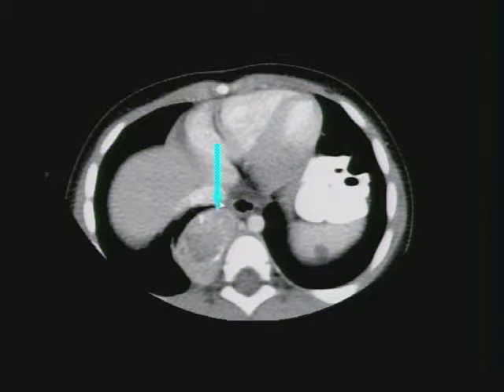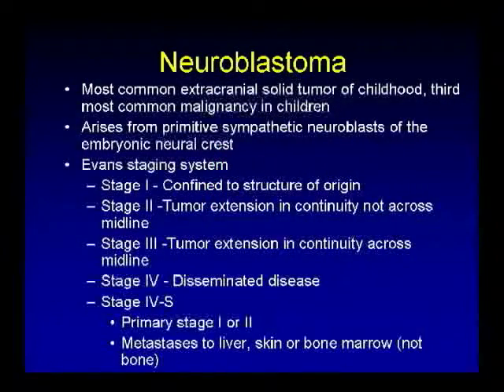The patient I showed you with those periorbital masses, the kid actually presented with bilateral ecchymoses or raccoon eye deformity, and here you can see that this patient has neuroblastoma with a calcified mass in the right paraspinous region. This is an incidental pineal cyst. It's not uncommon for patients to present with bony metastases with neuroblastoma, and they may start working the patient up for non-accidental trauma with bilateral black eyes, and you have to realize that, nope, they have a tumor.